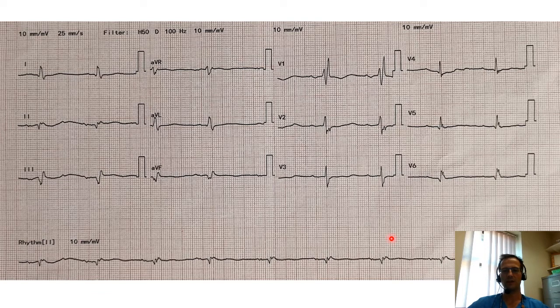So I bet you can't guess what this ECG shows. Well, don't guess, have a look and tell me. So we've got another broad QRS here. Can you see it's a nice clear M shape in V1? Look how narrow it looks in V4, but again, go back to the rhythm strip. You can see that these are not ventricular ectopics. This is a consistent rhythm all the way through. This is just the way it happens to appear in V4.